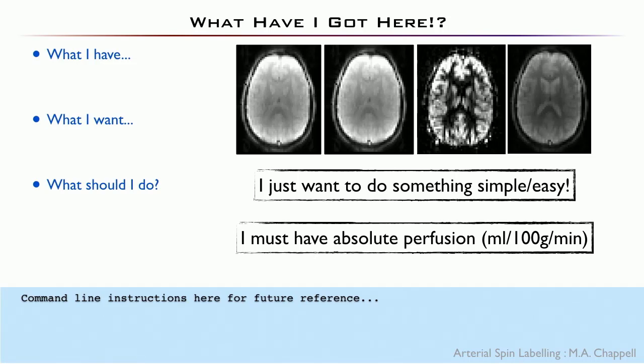For future reference, I'm going to put some command line instructions across the bottom. If you see the blue box, feel free to ignore it. Because the talk's recorded, you can come back to that later, but it's mainly just so you can see what I have done if you ever want to try and do it yourself.